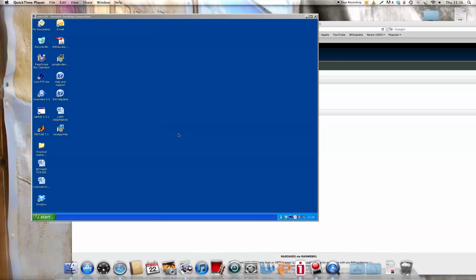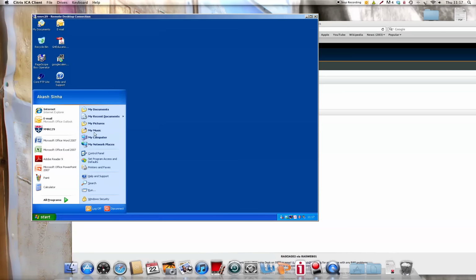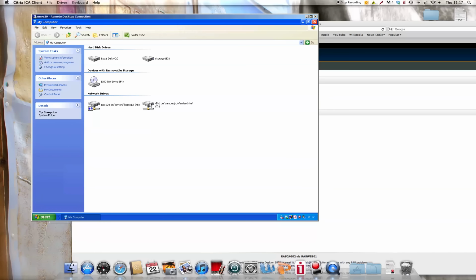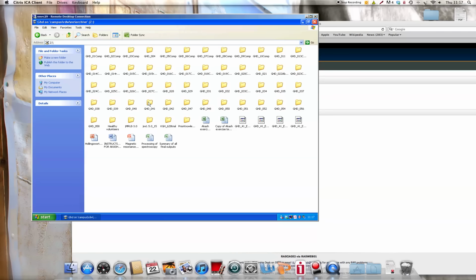Okay, so this is how to process the JMRUI software. This is based at the MR Centre at Newcastle Hospital, Newcastle University. I'd like to thank Dr. K Hollingsworth for teaching me how to do this.